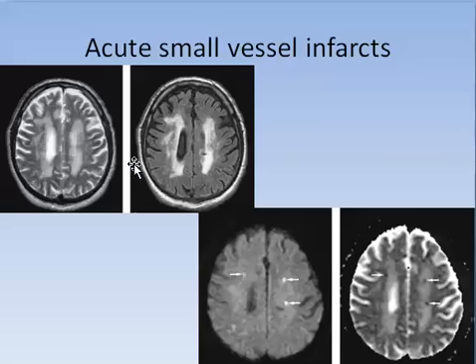Acute small vessel disease: T2 weighted image showing the lesions as periventricular on both sides. FLAIR showing them more apparent. Diffusion weighted images show periventricular hyperintensities of restriction, while in the ADC map only foci of negative or low intensity are seen, denoting small cores with extensive edema of penumbra.